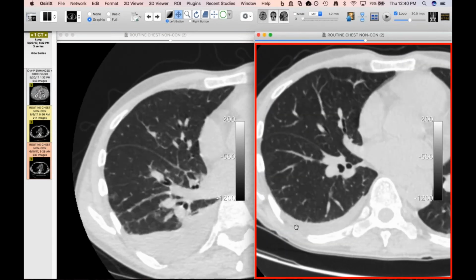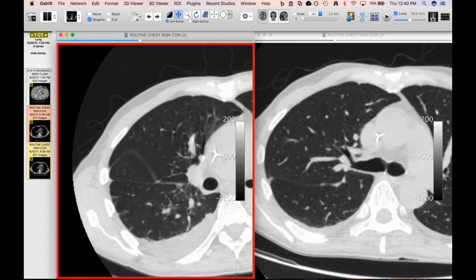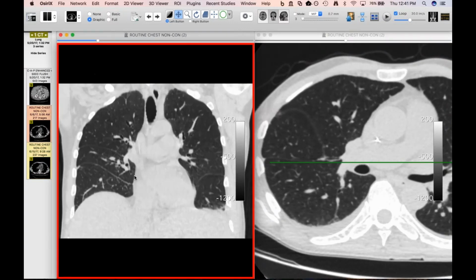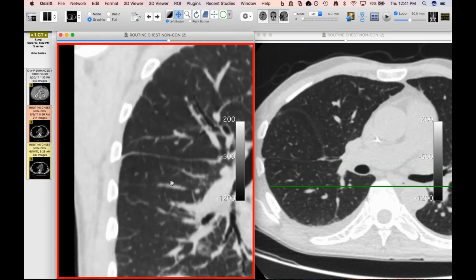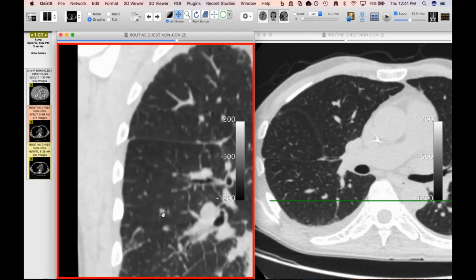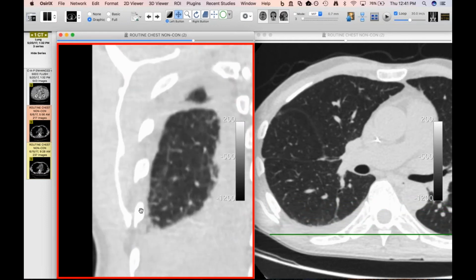Yeah, septal lakes. What's the term you're using these days? Because lymphatic pearls was the first one. Well, it was based on the original article that described the phenomenon. They called them lymphatic pearls, but we wondered whether the water is really in the lymphatics or just in the septum, so we decided perhaps we should call it septal lakes. I like septal lakes better too, but it sounds like real estate development. Oh yeah, there's septal lakes. Yeah. So that corona is really nice, because one can see that they correspond to interlobular septa. Sure, I totally agree.